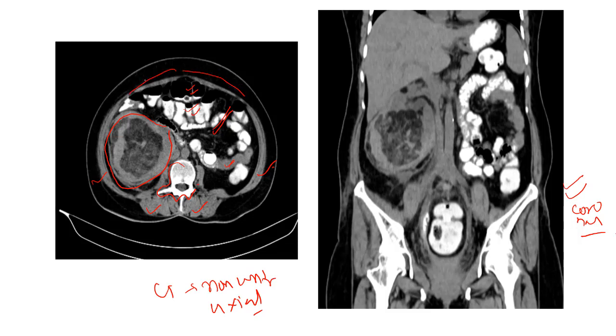And the subcutaneous tissue is here. What we are seeing is a round to oval shaped mass lesion with some hypodense component as well. When the HU was measured, it was nearly minus 80. So what has minus 80 HU? That means it probably consists of fat. So it is a mass lesion with mostly fat component, with some hypodense areas within.